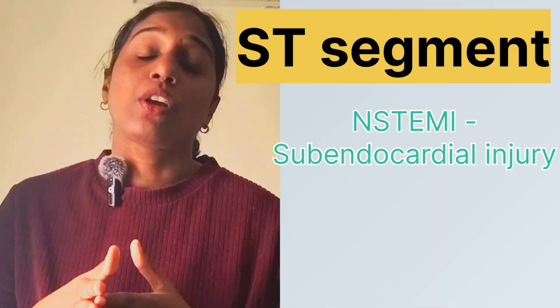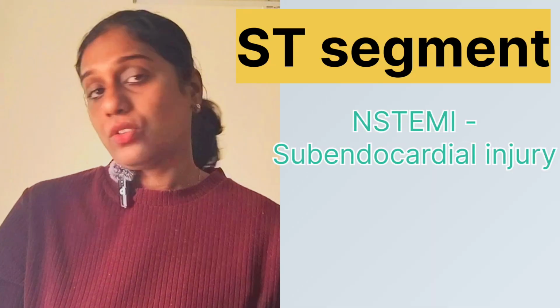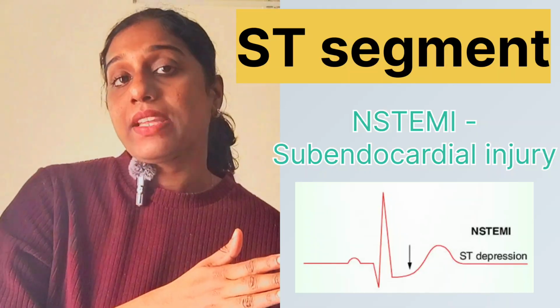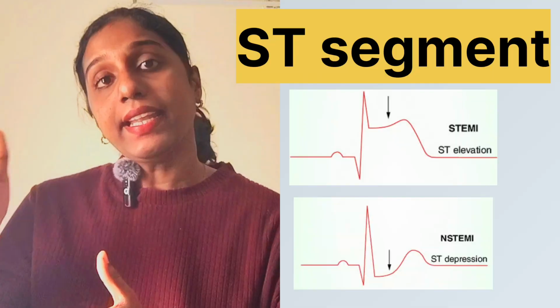But in case of NSTEMI, subendocardial injury occurs. That is, only partial occlusion is happening, not full thickness. So we will get an ST depression. So in STEMI, we will get ST elevation, and in NSTEMI, we will get ST depression. So that's all about the ST segment.